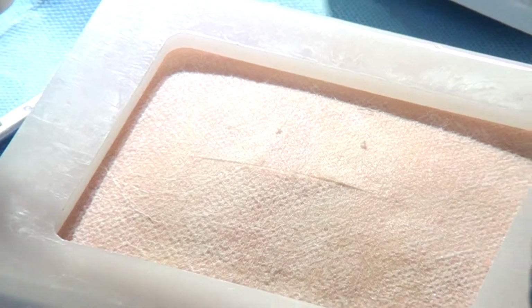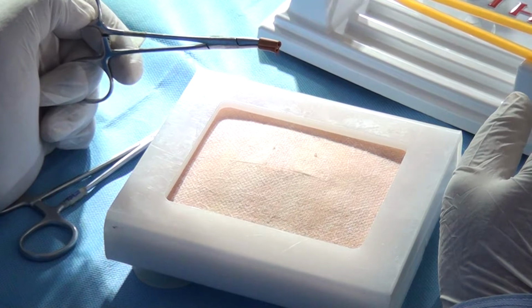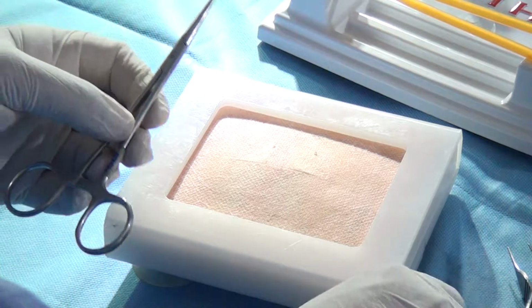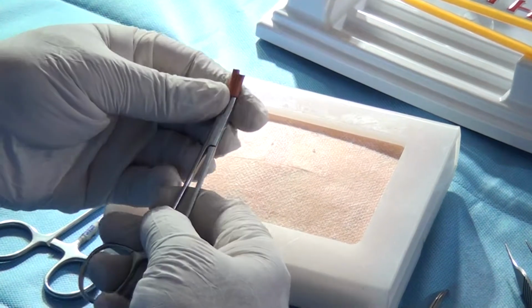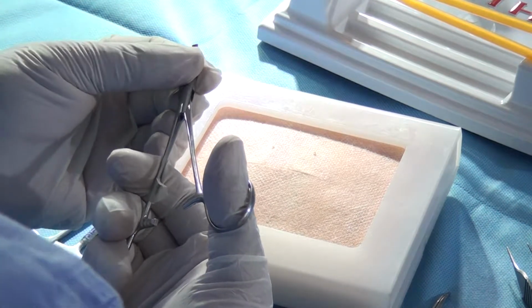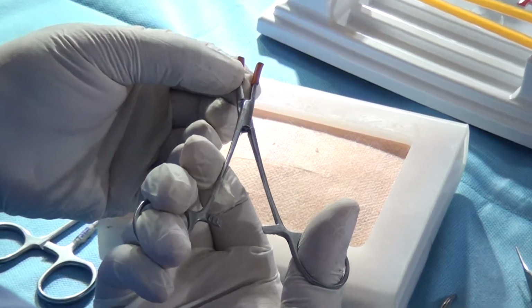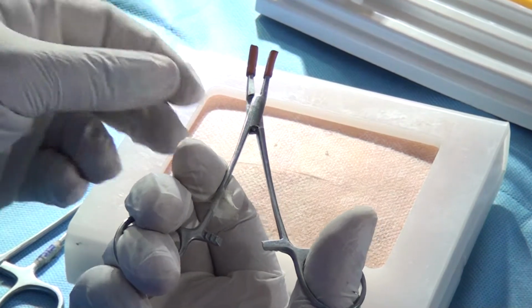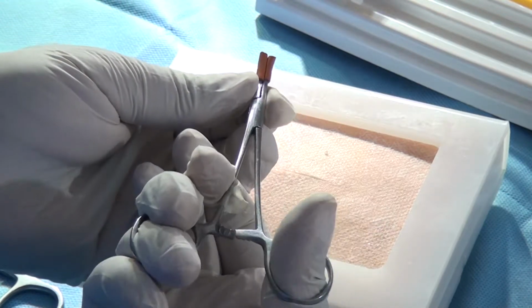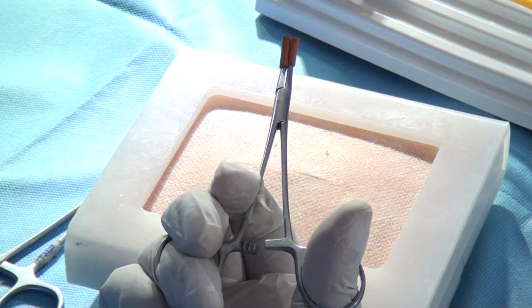We don't have it here, and don't worry about it. Kelly is the name of a surgeon, K-E-L-L-Y, E-Y or Y, it doesn't matter. Now it is a traumatic instrument, I have already told you, but you can make it less traumatic by loading some latex on it. And this loading can be with a rubber pad or you can cut a feeding tube and load it. If you are in the field and you have nothing else, you can use it for holding a vessel also. It will be less traumatic. There is nothing atraumatic in this world. Less traumatic, relatively less traumatic.